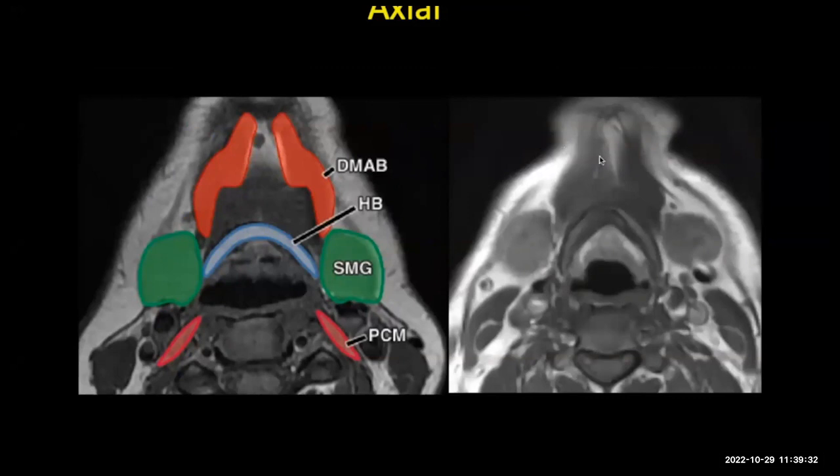This is the 1A lymph node over here. Now, why are these submental and the submandibular compartments important? First of all, they form the floor of the mouth, and if the disease has gone beyond the surgical floor of the mouth, it's an advanced disease. Reaching up to the hyoid bone will actually make the disease unresectable. Also, the nodes which are present in this area guide you as to which part of the tongue is involved.